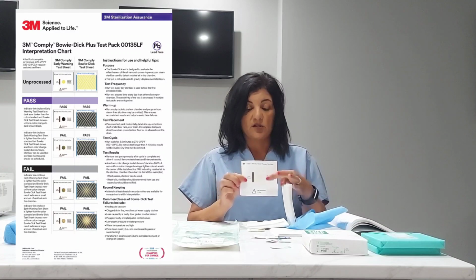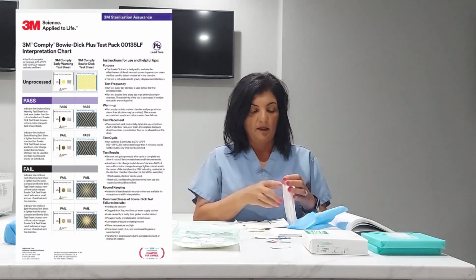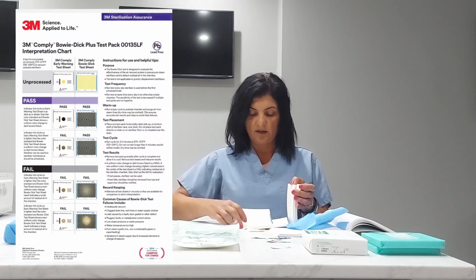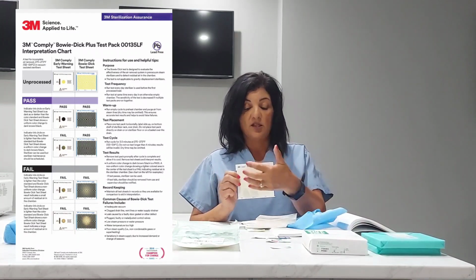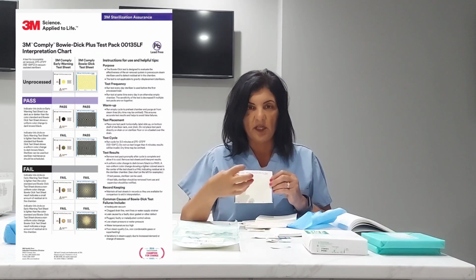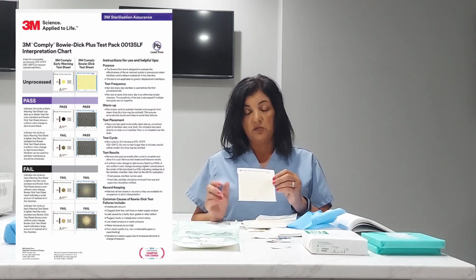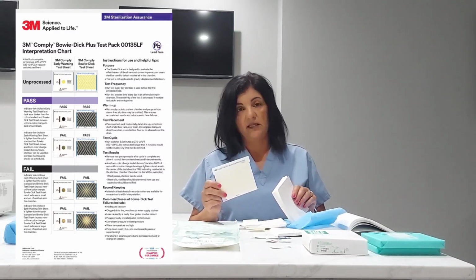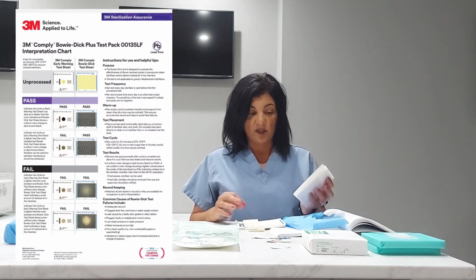So what happens is it's challenging for the steam to get through here. Again, the circle is yellow. Had it been exposed to sterilization, this circle will be black. Then the other card in here should also be yellow, and it is. Once this entire pack has been exposed to sterilization, these lines should all be perfectly black. If there's any variation, any weirdness, any fluctuation in colors, that's an indication to me that my sterilizer is not functioning properly. So I would want to rerun the test at that time, but I just wanted to show an example of a type 2, and also this is a process challenge.